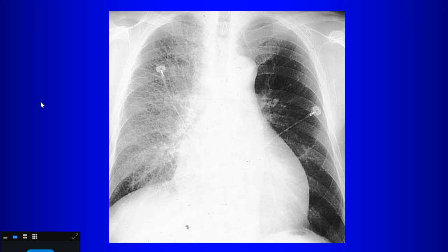Pulmonary embolism, where would the pulmonary embolism be? Pulmonary arterial? Yeah, pulmonary arterial, but where would the clot be in this patient? If this is a PE, where's the clot? So can PE cause unilateral pulmonary edema, and how?